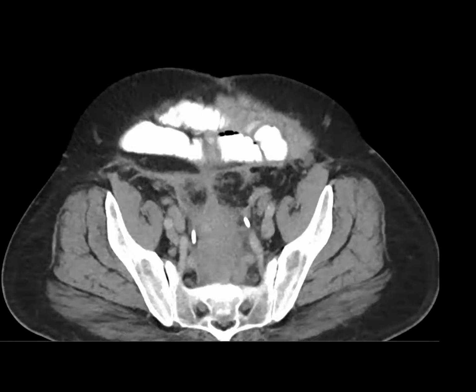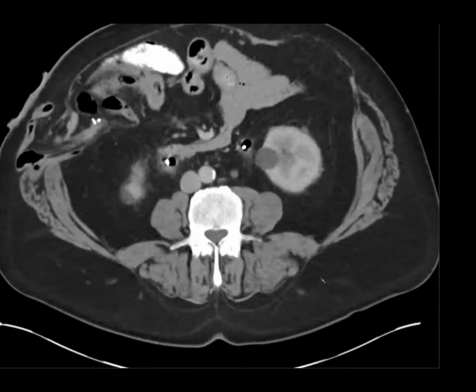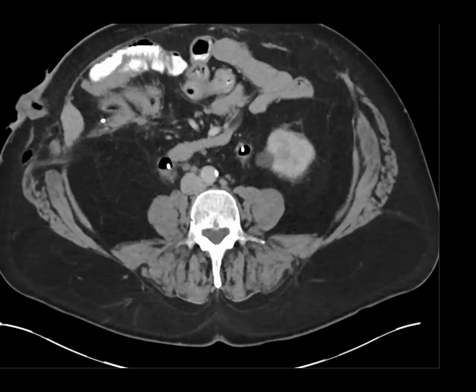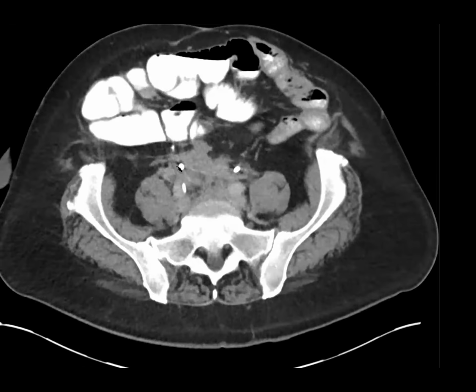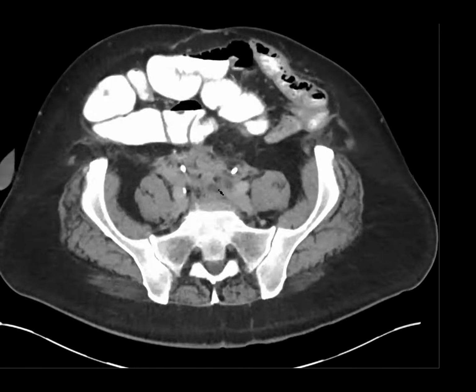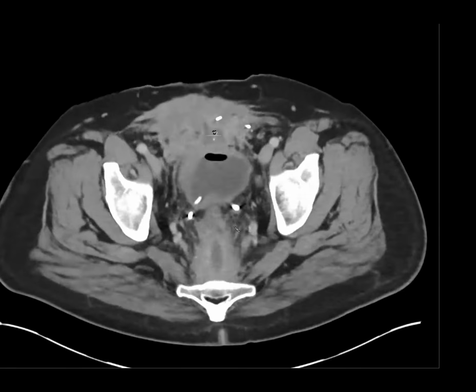I have a couple of companion cases for the retroperitoneal fibrosis. This patient had a total colectomy. They have FAP and Gardner syndrome. And you can see that they also have ureteral stents and hydronephrosis. And they have this infiltrative soft tissue down here that in this case was actually extending anteriorly. And so this is also infiltrative desmoid type fibromatosis in this patient with Gardner syndrome.